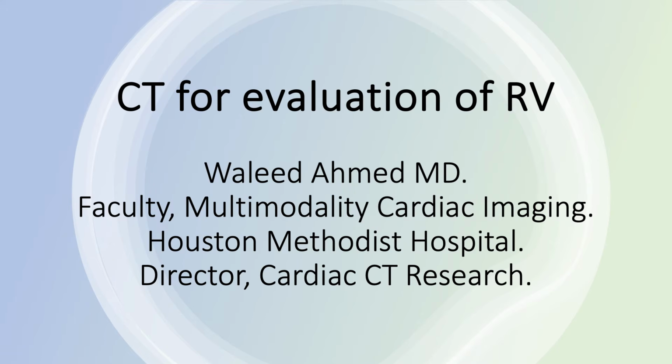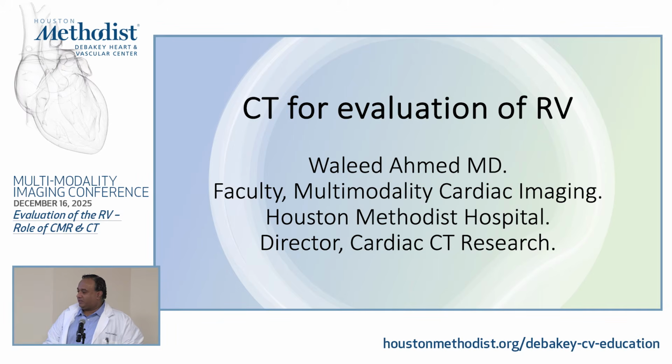So we'll switch modalities, and I'll talk to you briefly about how we can utilize CT for evaluation of RV function. And of course, you must be wondering why are we even talking about it. We have MRI, which is excellent.